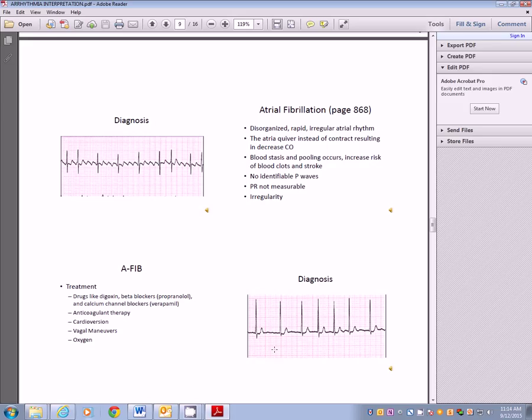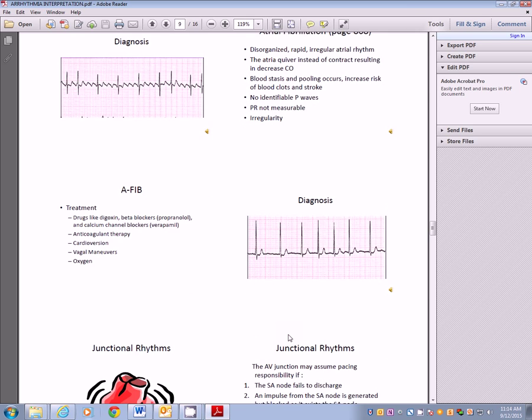So about right there to there. And if we were to walk it off, you can see it's very irregular. There's nothing regular about it. Not a single one of them. So that's your big clue: when it becomes irregular, we have gone into atrial fib.